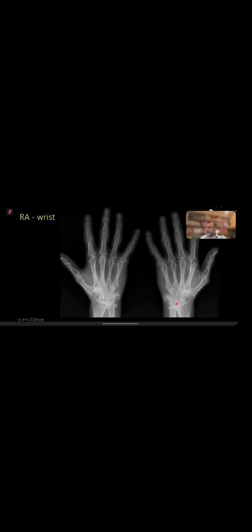Okay, so look at these two X-rays. Maybe some erosion there, not sure, but look at that, the erosion here of the triquetral bone. Another erosion on the opposite side of the same patient. And again, erosion on the ulnar side. There's erosion of the styloid process, big erosion. This side, not eroded, looks like chronic erosion there, but of course the patient has other erosions as well. So this is established erosive change in the MCP joint and the wrist joint.